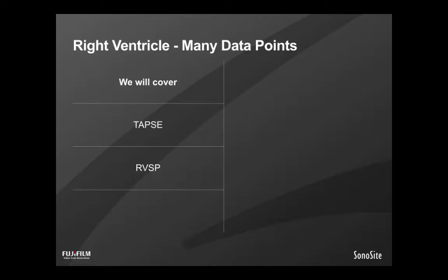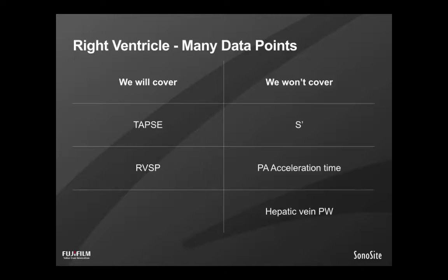But what we will cover today is TAPSE, also known as tricuspid annular plane systolic excursion. You can see it earns its acronym honestly, given what a mouthful that is. So TAPSE it is. And we'll also talk about right ventricular systolic pressure determination, or RVSP.